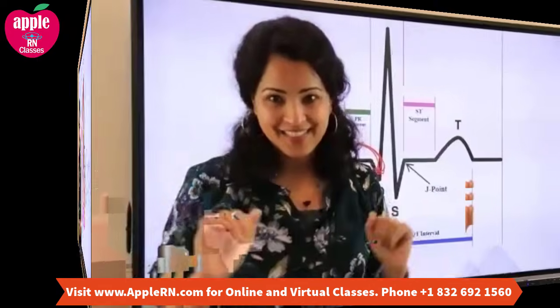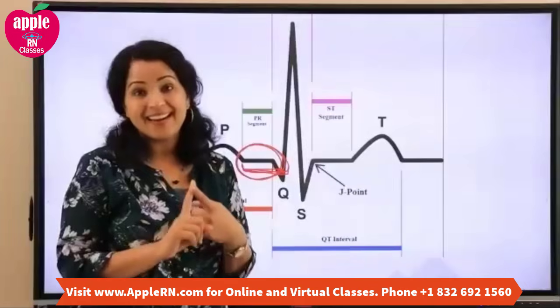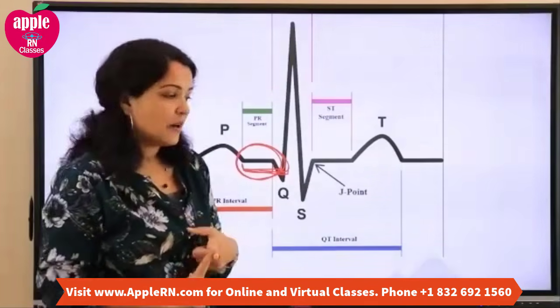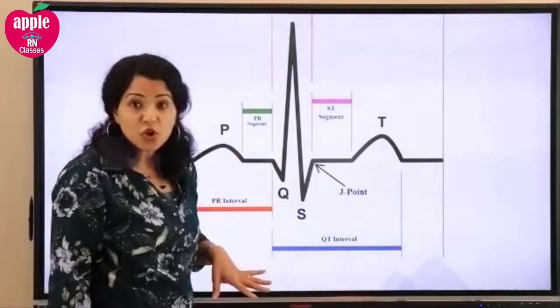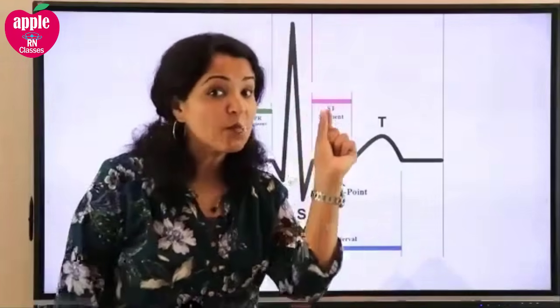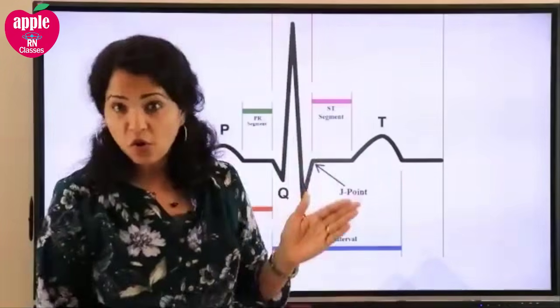Okay. Now we need to remember what is the normal PR interval. I mean, that's something we need to know, the number. But at least if you don't remember that, you have to remember it should not be more than 5 blocks. The ECG has small blocks. Okay. So up to 3 to 5 blocks is what normal is.